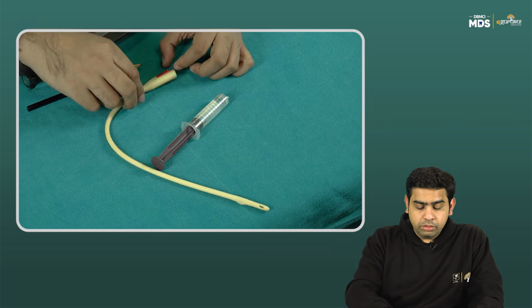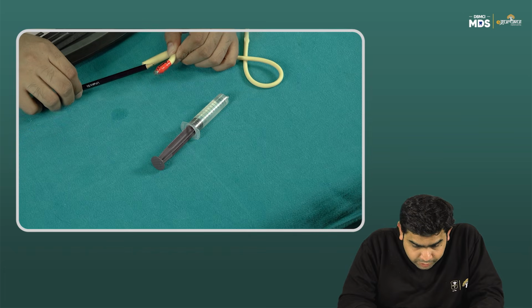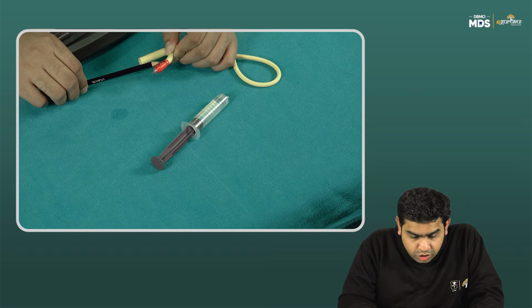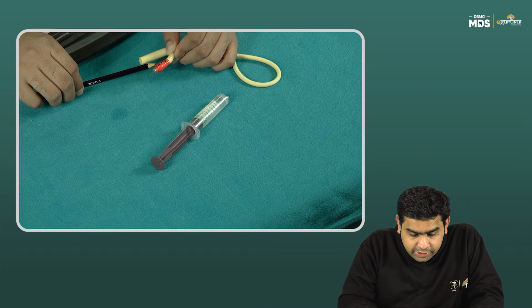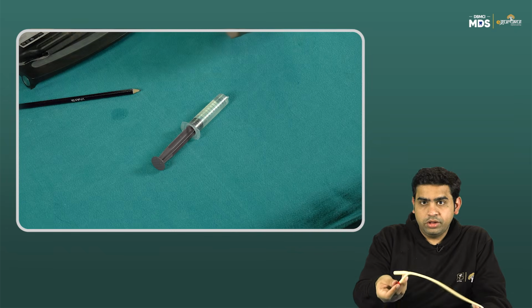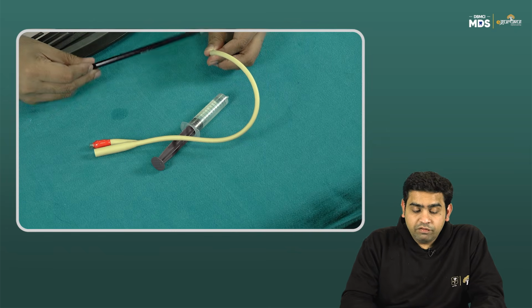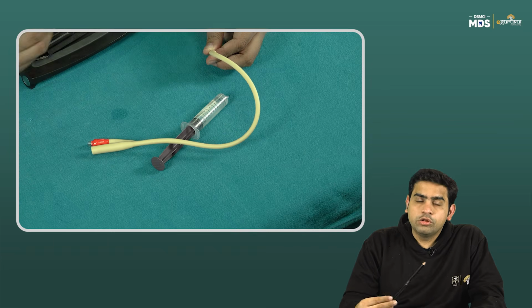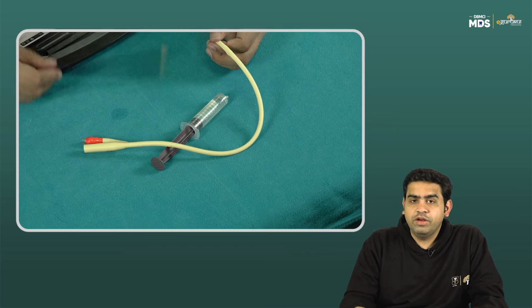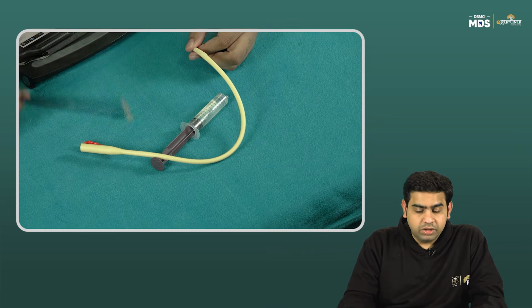On this particular catheter, you have a lot of information. As I can see over here, it is written 18 French channel and 30 to 45 ml cc. So in other words, this is a Romson's catheter, and this balloon, I inflated just 10 ml, but you can inflate up to 30 to 45 ml. In catheters of a bit bigger size, for example this 18 French catheter, you can inflate more fluid in these balloons, 30 to 45 ml.